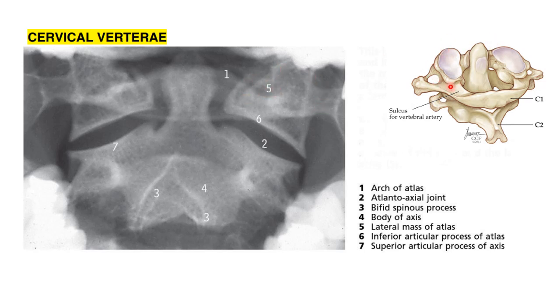Same as what you see here, of course, you have an articular process above and an articular facet below. So 6 is the inferior articular facet. I think the better name is a facet rather than a process. So we can call the lateral mass a process and 6 a facet. Okay, so this is the facet. Now that's all about the atlas, and of course the transverse foramen can be hardly made out here, which is not shown here. Okay, fine. So these are the things I would like to say about the atlas.